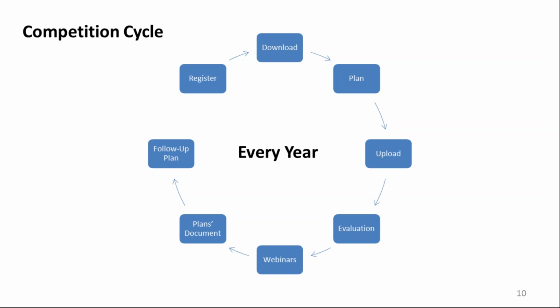So if they scored, let's say, 50 or 60 on the original submitted plan, they can use these guidelines and try to improve their plan quality. I have just an example of this already, even though we are way before September. Some of the top planners actually already did such a thing, and I will show you how he improved his plan just by attending another webinar from a different planning system.